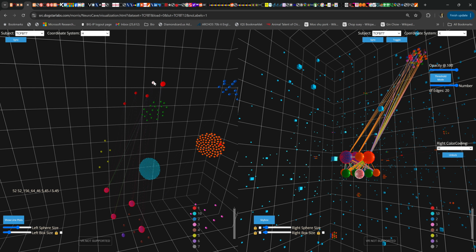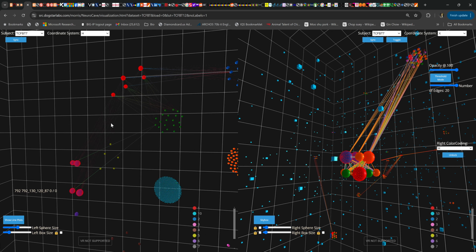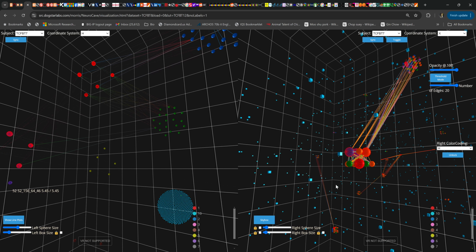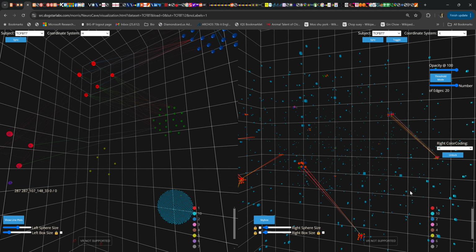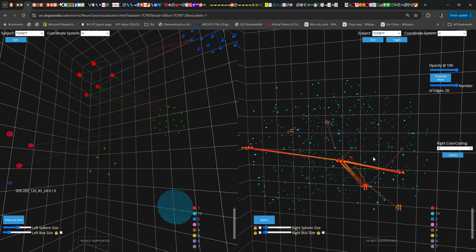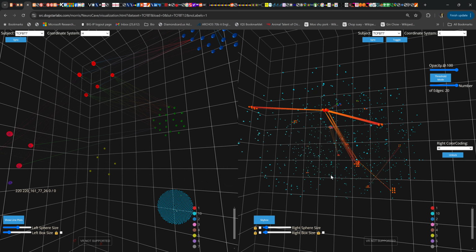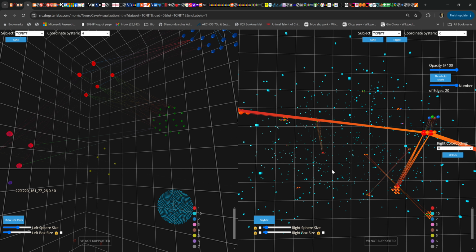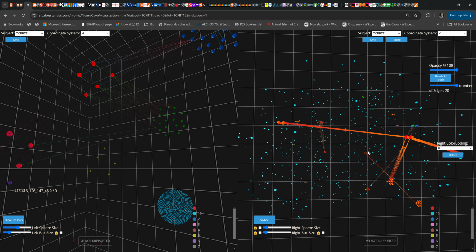And this way we can fill in the edges of this graph and compare the cluster membership orientation view of the graph with the anatomical translation of that, and perhaps gain some insight into the progression of this glioblastoma in this individual.